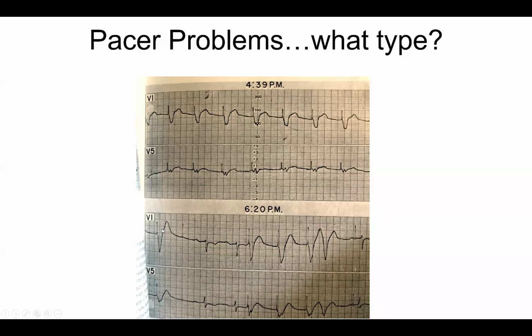So this beat, does everything look okay here? I think it looks somewhat similar to the previous. Okay, so I have a pacing spike, it looks distorted, so I don't know. Yeah, it is a little distorted. That was another problem, by the way, with old-fashioned Holters. They were actually on cassette tapes, and sometimes the machine would move a little faster or slower, and so the QRS would widen or narrow, and you had to sort of figure that out. But anyway, eventually they became digital.